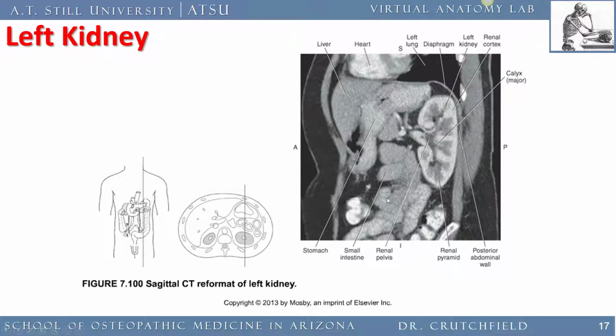This is small bowel in here. It has a little bit of contrast in it. That's why it's speckled and a little bit white. Here's the colon, the large intestine. It has a little air in it. This is small bowel here too. But most importantly, what we're looking at here with the kidney, so this is going to be the pelvis. Eventually, this is going to go and turn into the ureter.